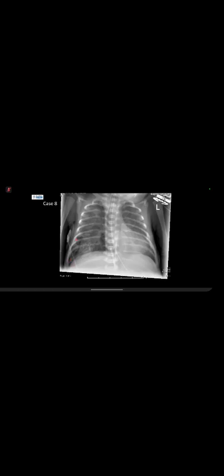So this is actually the sign which was picked up really well by the candidate. Pneumothorax is tough, and usually in supine portable films, especially when there is ventilation, you are not going to see the air rise up to the apex. This is something that you always have to look for and make sure you don't miss.